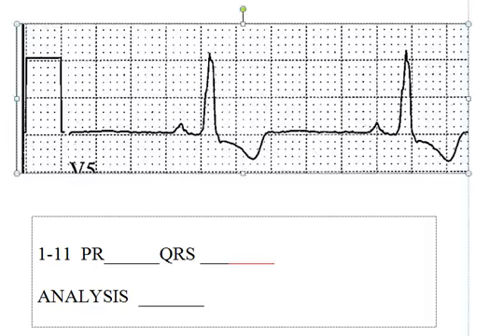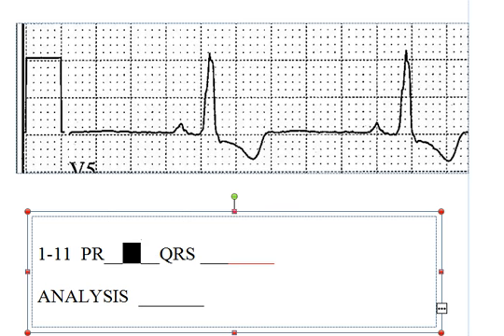We are on in-class practice, second page, which is 1-B, and we are on strip number 11, 1-11. Okay, if I'm looking at this, I see that we have a nice P wave here. It starts right about at that little line, goes right about to the heavy line, maybe a little bit before that. That would be 4 little boxes, or 0.16. 0.16.